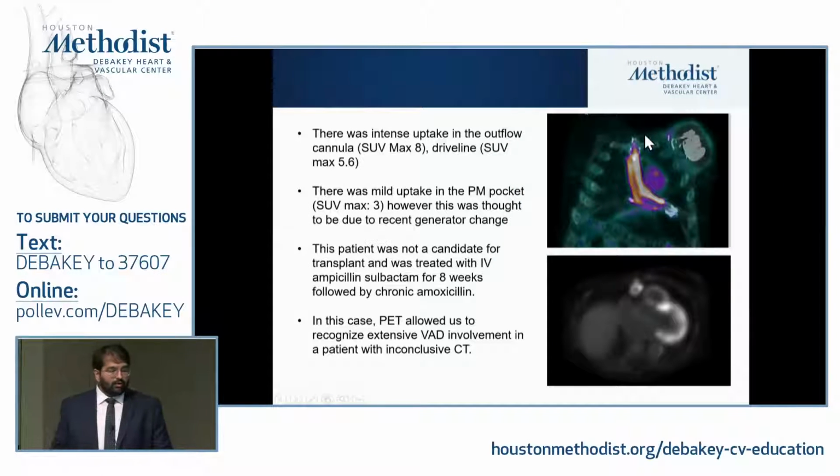And we could also see he had a generator change shortly before this. We can see that there was uptake around the generator pocket as well. This was thought to be inflammatory, not related to the infection, just because it was so recent and because he had no signs of infection around the pocket. I'm going to talk about pocket infections in a minute, but just so you know, this is the slew of information we can gather from one study.